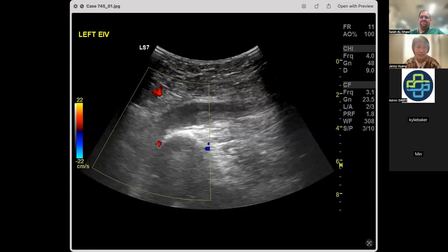So it's a curvilinear ultrasound still image of the left external iliac vein. There's color Doppler that's been placed on the image. I'm not seeing any color over that left external iliac vein. I'm therefore suspicious, but as discussed before, I've got to check the gain, make sure that I haven't undergained or overgained. I probably will have to change the direction of the probe to look at it in two planes as well and check.